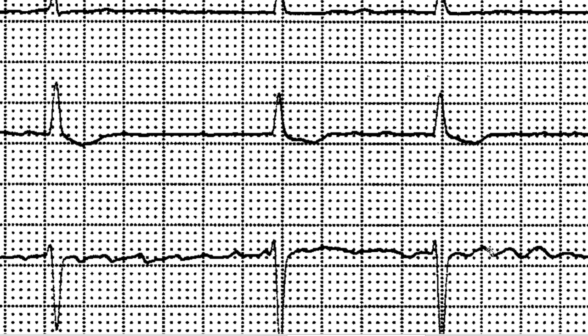So the frequency is going to be about 500. I sure hope I'm right. Yeah, roughly it's about right. So it's about 3-ish, 4. Frequency is going to be somewhere between 400 and 500. Okay, roughly around that range, and it's fibrillation.